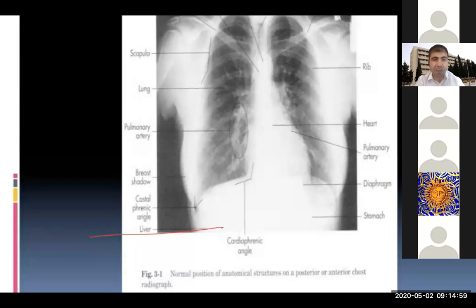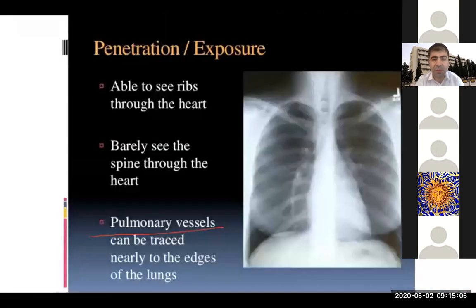So this is a diagram with annotation of the chest X-ray showing you the normal tissue. Before interpretation, you have to know whether this chest X-ray is diagnostic or not, whether it is a badly qualified chest X-ray. We should assess the penetration. Is it good or not?